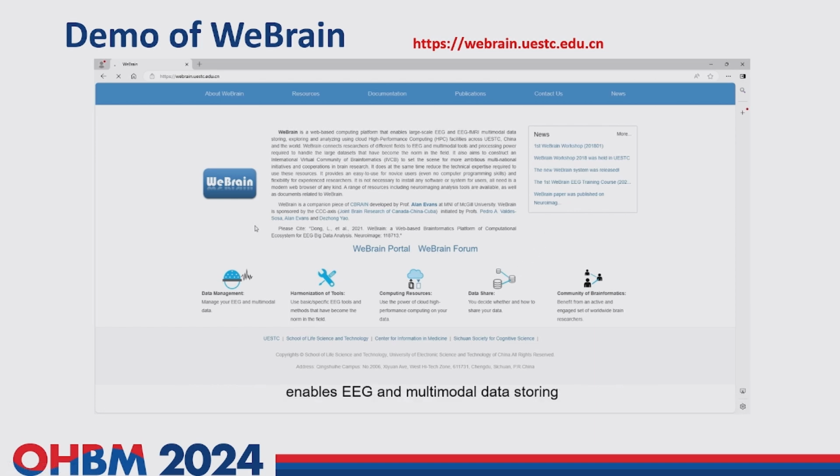WeBrain is a web-based big data management and computing cloud platform developed by the University of Electronic Science and Technology of China, enables EEG and multimodal data storing, exploring and analysis standardizing. Users can log in and use the cloud platform through a web browser, without any programming, software, or system installation requirements. In this video, we will briefly show you how WeBrain works.